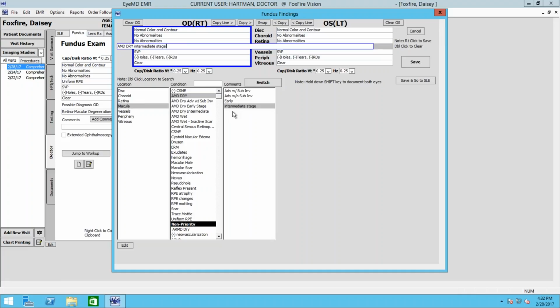Yes. And then do you click save? No, if you're done documenting in here, then yes, you can click save. Otherwise you go down to the next one on the left, or whatever. If you need to do more, then you just keep documenting until you're done.